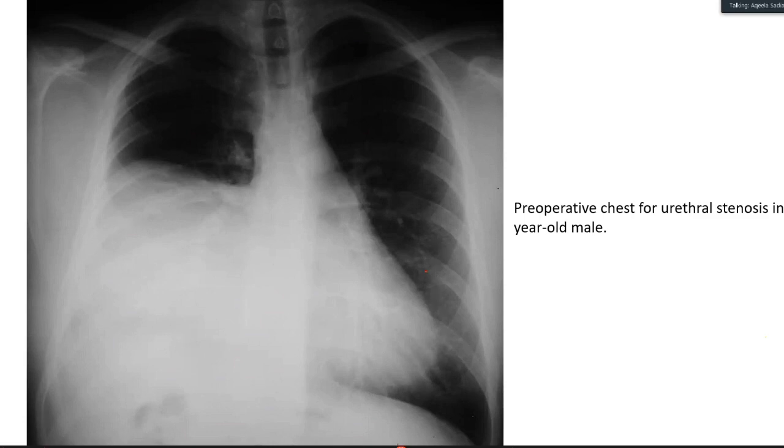This is a chest frontal projection of a 26-year-old male, and this is a pre-op X-ray for a surgical procedure. I can see there is an opacity in the right hemithorax, covering almost the lower half of the thorax, and causing mediastinal shift towards the contralateral side.